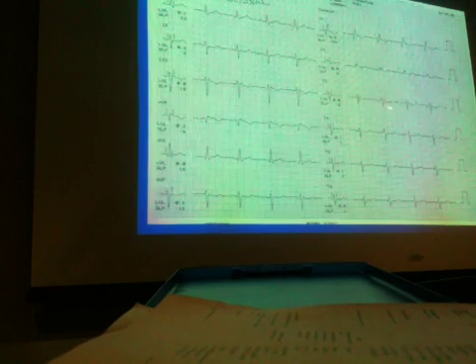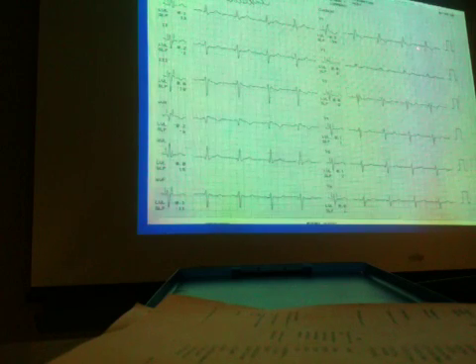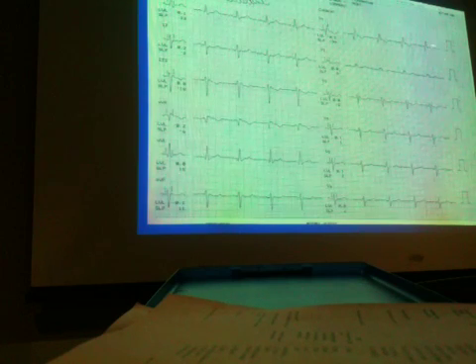You see how you have two R waves? You see the rabbit ears there? Right there? R, S, R. Then it comes back down. You see the little bit here, you have a little bit of an R wave. Remember, our first upward deflection, as tiny as it may be, is an R wave. So it goes up, down, and up again. You see that?